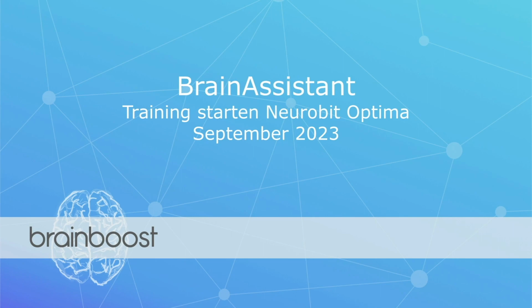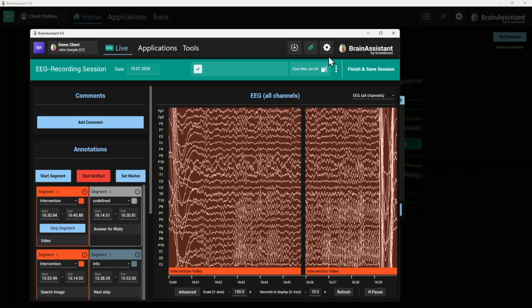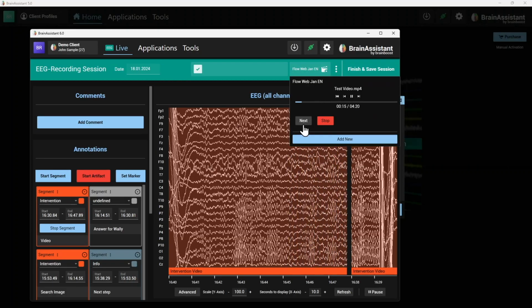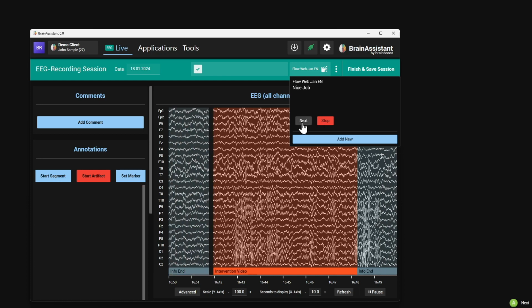Now it's praying. As I said, we didn't say whether it was right or wrong. This would be a decision tree. It's more complicated. Now it's showing a video. It's showing a recording of me, so it looks strange now. I'm hearing my own voice. Next, it's playing a video.